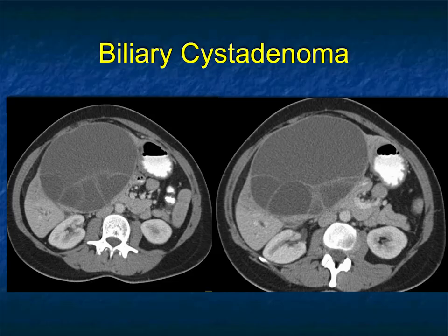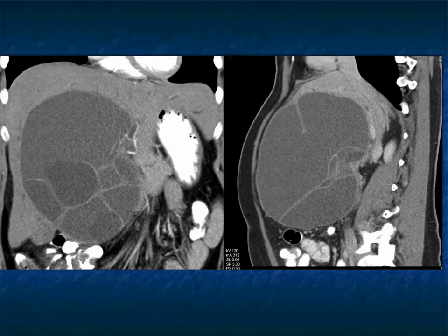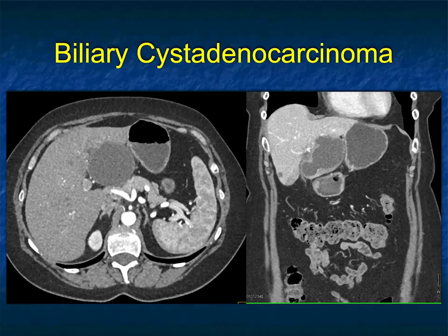So let me finish with a couple examples. Nice biliary cystadenoma, complex cystic lesion with multiple septations, no intrahepatic duct dilatation. Again, differential diagnosis could be a biliary cystadenoma, which this is, or it could be a hydatid cyst. That would be a possibility. You would not be calling this a simple cyst. It doesn't have the look of a cystic hepatoma or metastasis. There's no thickening or enhancement around the edge of the lesion.